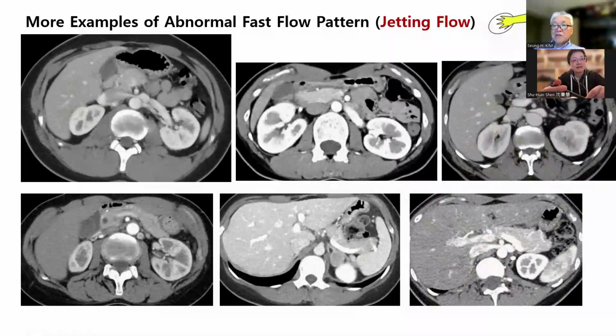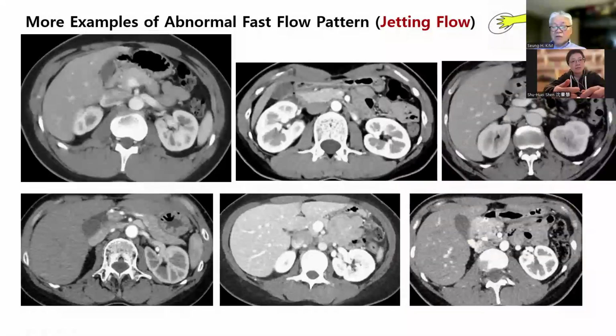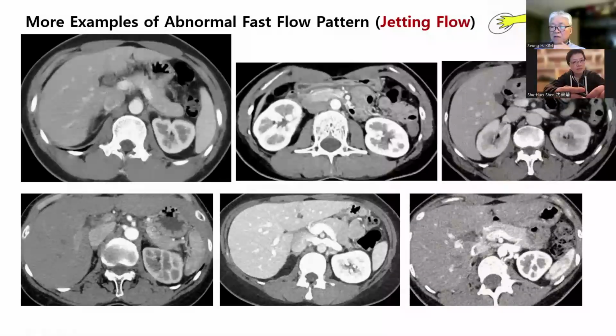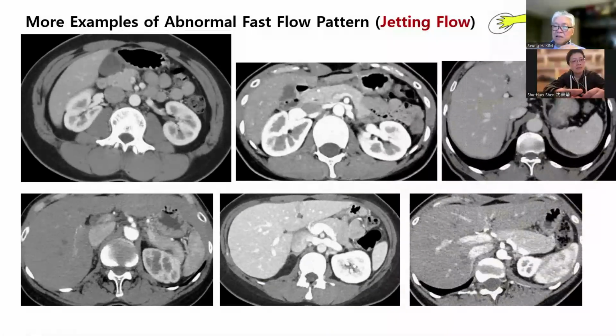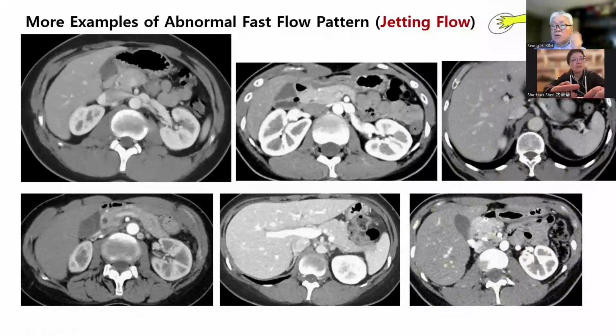In some cases, even when there is no evidence of any compression, we can see some kind of pattern 3 or pattern 4.